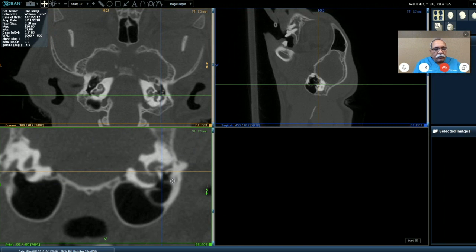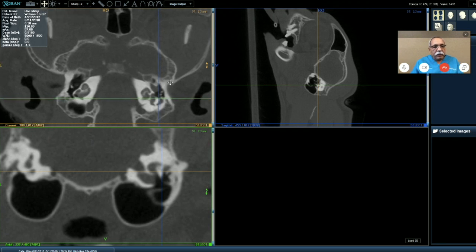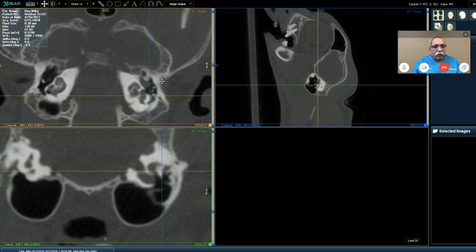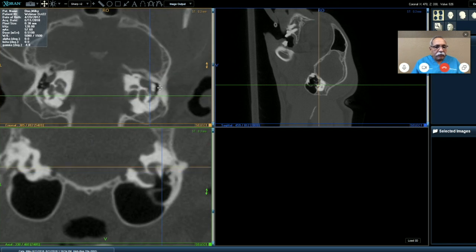In cats, when you're looking at the ear CT, you also want to look at the eustachian tube that goes into the nasopharynx. In cats, it's extremely difficult, but David is going to try and see how far we can follow the eustachian tube. So on the dorsal aspect, that black area that's jutting out, okay, I'll stop right there. Here are the 3 semicircular ear canals, right there, 1, 2, and 3. Okay, they're pretty large then. Yeah, they are pretty large.